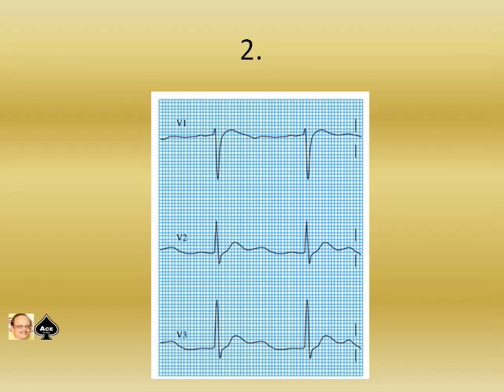Now there is exercise number 2 showing an ECG. Read the ECG and find out what is the abnormality. Just a few seconds, because in the exams, especially in the objective structured clinical examination, hardly 30 seconds are given, because you have to read the clinical details also. You can always replay the video.